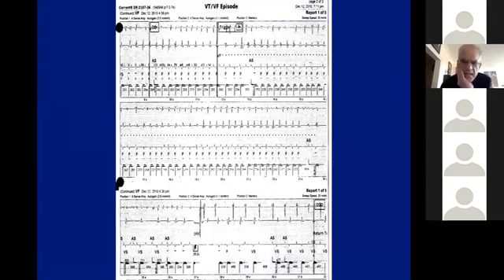This is a little small, but you can see that all of a sudden the ventricular rate accelerates. It's very, very fast. Cycle length about 250. Is it actually compatible with rapid atrial fibrillation, or is it so fast that it is incompatible with life? And then it goes even faster and then organizes itself, very regular, with a slightly different electrogram.